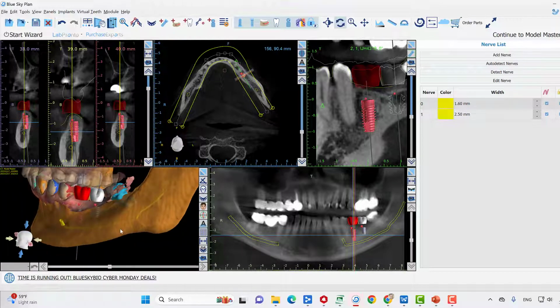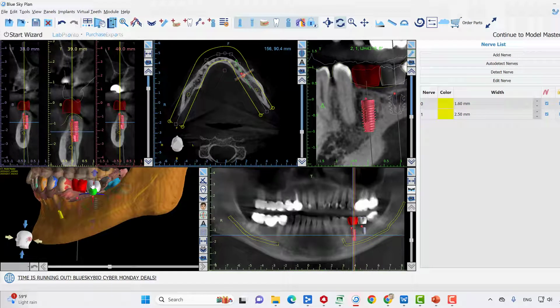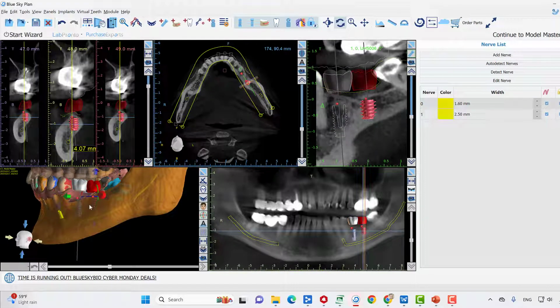Okay, so now we've got our prosthetic setup and our implant setup, taking into account all the anatomical landmarks. We have good bone, we have good stability here in the bone. Although it's a 6mm implant, this could be kept separate, especially in protected occlusion with a wisdom tooth behind it. I know some people like to splint them prosthetically. Either will work well.